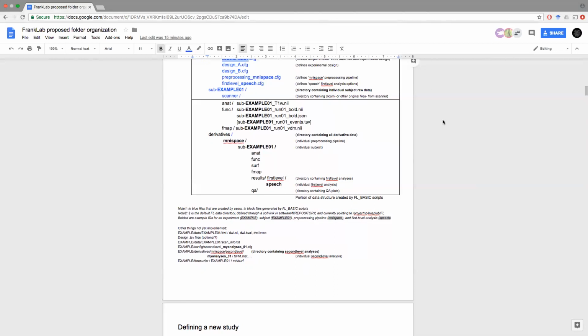I typically use the T1 files myself, and I think that for other steps it makes a little bit more of a difference, particularly if you try to normalize that data. It's going to work better if you actually have the skull than if you don't. But the latest iterations of SPM are smart enough to work correctly with skull stripped anatomical data as well, so that shouldn't make too much of a difference.